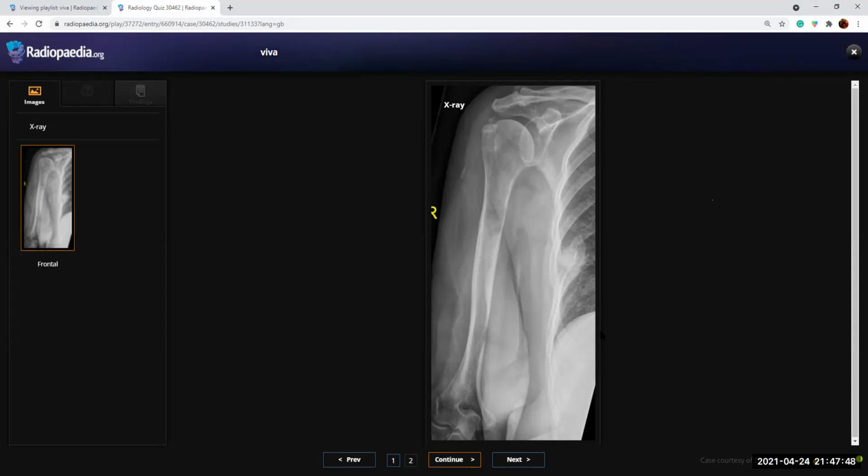I have suspicion of a lucent lesion involving the diaphysis of the right humerus. Plus, I can see that there is a soft tissue density lesion in the mid zone of the right hemithorax. I'm trying to ascertain whether it is in the lung or in the rib, because I can see adjacent destructive lesion, destruction of the adjacent rib as well.